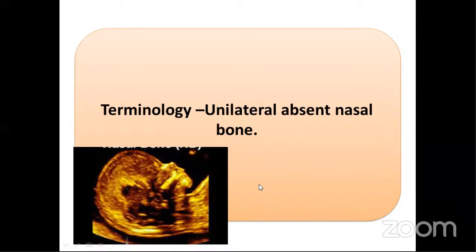And if we are very sure of seeing the anatomy, seeing the retronasal triangle, seeing only one nasal bone at the apex, others not seen, somewhere we should make a note of that and then call her back at 16 weeks to assess, so that we don't get blamed for missing that absent bone, which will be missed at the 16 weeks, and the blame game is not happening.